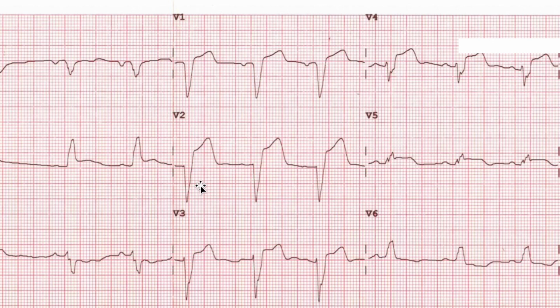And the depth of this S wave, going from the isoelectric line down, is about 11 millimeters. So is 5 millimeters at least 25% of 11 millimeters? Sure, it's 25% of 20, so it's definitely more than that when it comes to 11 millimeters. So that's highly indicative based on Dr. Smith's modified Sgarbossa criteria. And I like that he kept the name Sgarbossa criteria, giving Dr. Elena Sgarbossa the credit for originally coming up with the actual criteria.